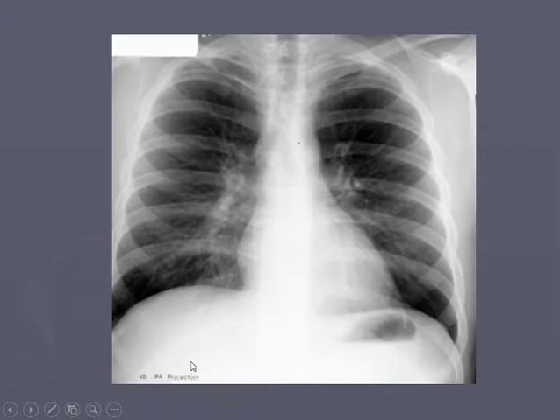That means the X-ray source is starting from the posterior, from the back, and going to the front. So this patient has their chest up against the wall, and the X-ray source is behind them, and the X-ray light is shining through their back, through their heart shadow, into the front of their chest and then right to the X-ray film. So there's not a lot of distance between the heart and the X-ray film.